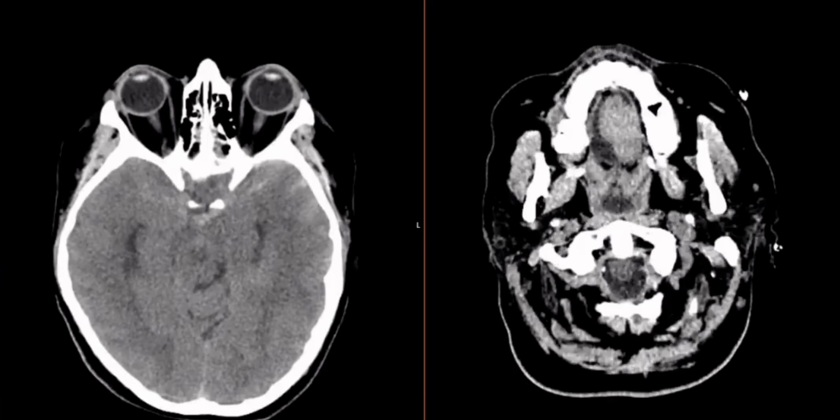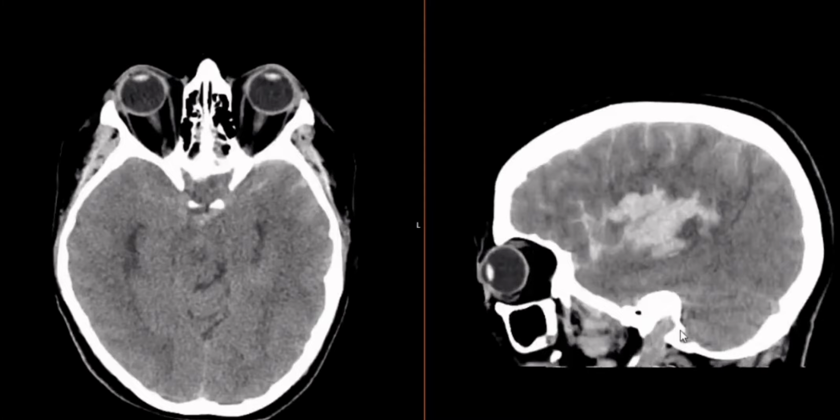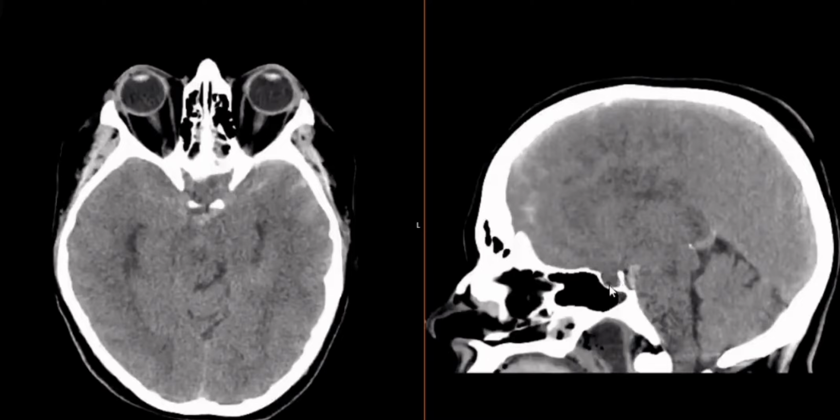If we look at that in other cross sections, do we have midline? It's always a good one to see, well, how much blood from front to back. But as we get to the midline, you see some important things. There's the middle. So about there, kind of just try and find the middle of the nose and the middle of the pituitary fossa. And then that, give or take, should be about the middle of the brain. And what we've got is the cerebellum, and it's starting to squeeze out south. The pons is pushing against bone.